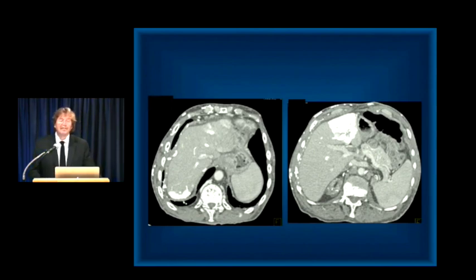The patient had multiple catheters placed over time. The catheter in the SVC for access eventually occluded. Patient has SVC occlusion. So SVC occlusion can be due to many things. It's not always going to be malignancy. It can be seen in patients who've had chronic IV access through the SVC, and just a very impressive picture.